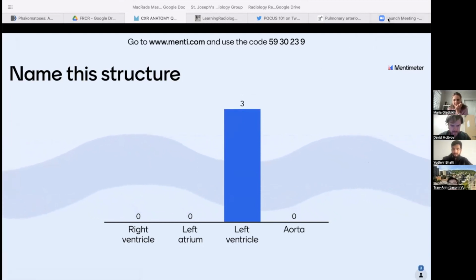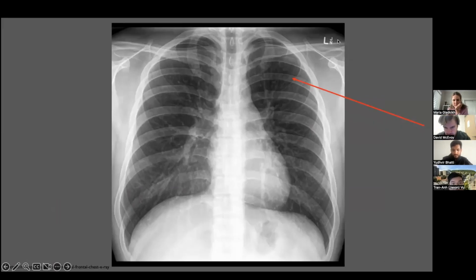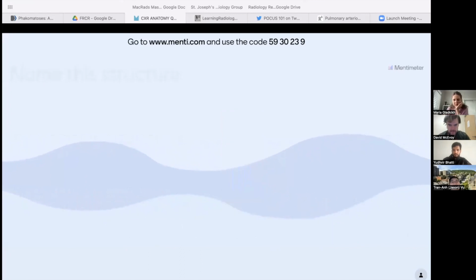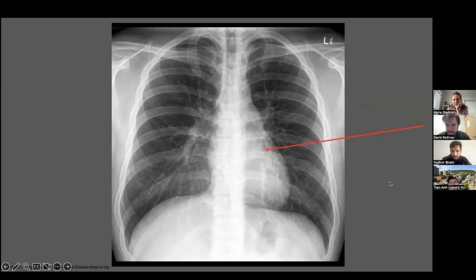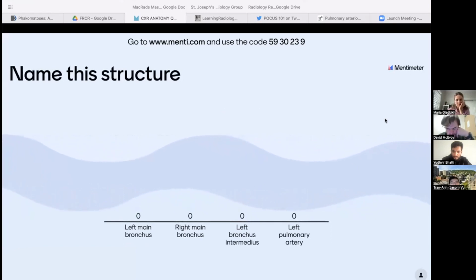Yeah, very correct. That is the left ventricle. I'll move on to the next one and then we'll bounce through the anatomy. What is this pointing to? Give 2 seconds to look at it and then I'll flip back. Be able to move on to the next one. Awesome. You guys are good. Probably don't even need to do this lecture. Okay, next one. Might be a bit vague with the arrow. Let me know if you want me to go back to the slide.